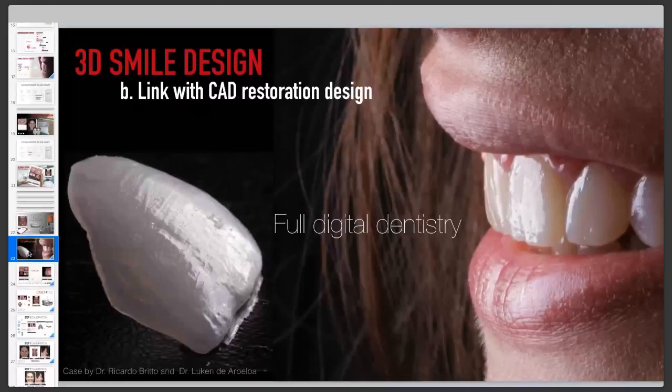Then we have the chance now to also design in 3D on the iPad and have these same files that we created adjusted, and later on they will become the final restorations, right? Everything is guided and the same shapes you pick at the beginning, you're going to have precisely at the end. So it's basically like the copy and paste principle that Christian always shares at the DSD.